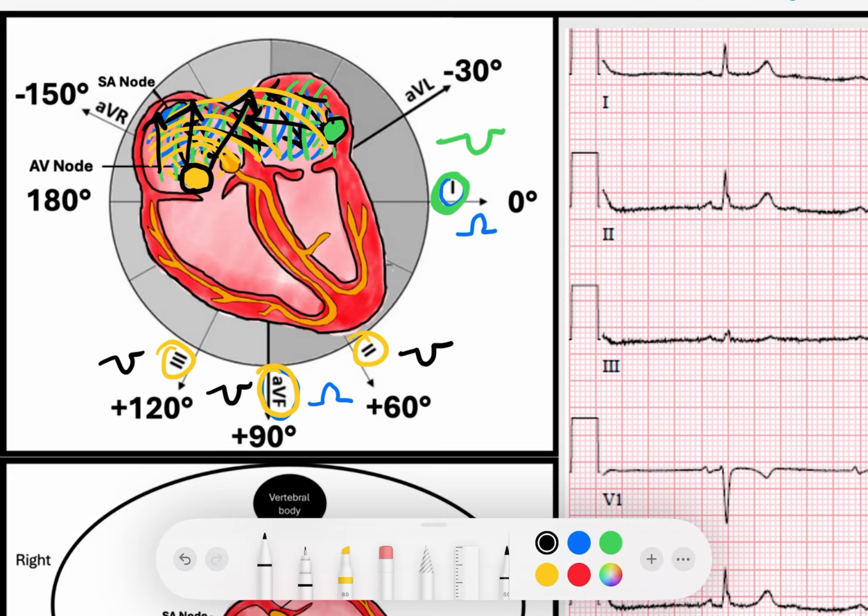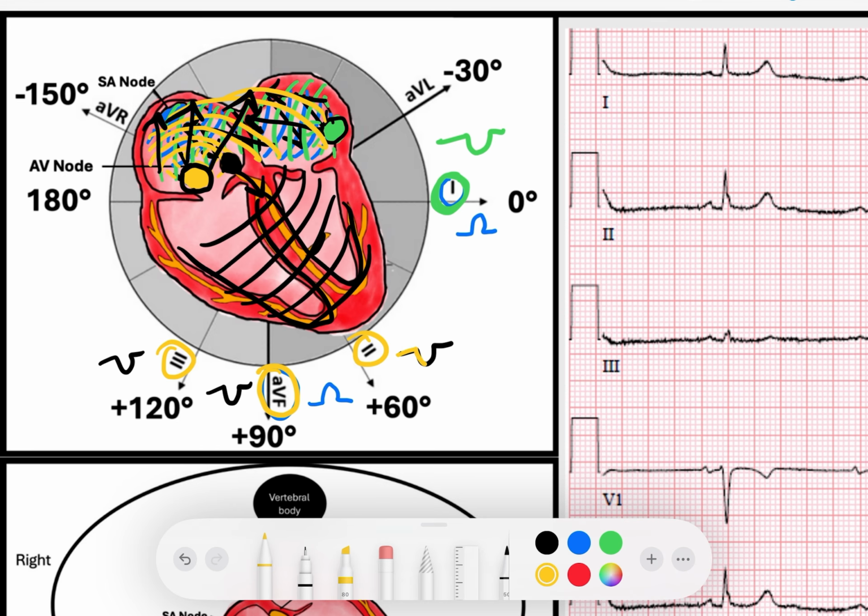Now, obviously, all of these PACs produce P waves, but every single P wave, right, atrial depolarization, will ultimately run into the AV node. And if the AV node is working well, the AV node will conduct that signal down through to the ventricles and produce a subsequent QRS. And that's why every time we see a PAC, right, say in this example, we typically will see that QRS to follow, right? Which is why PACs will typically conduct to the subsequent QRS.